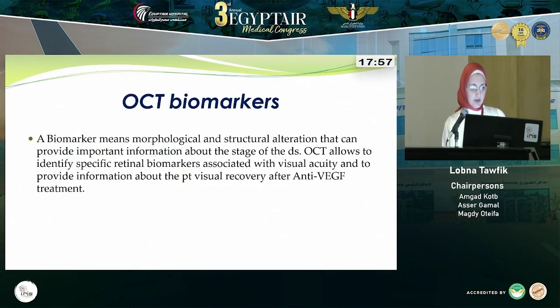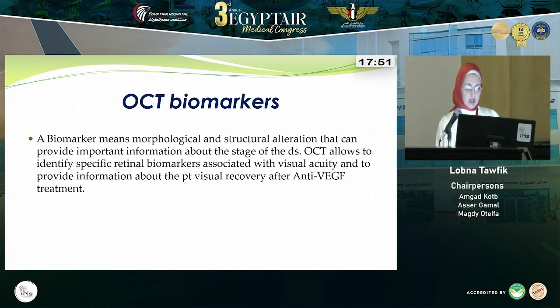OCT biomarkers. A biomarker means morphological and structural alteration that can provide important information about the stage of the disease. OCT allows us to identify specific retinal biomarkers associated with visual acuity and provide information about the patient's visual recovery after anti-VEGF treatment.